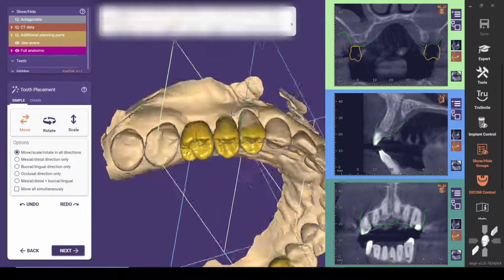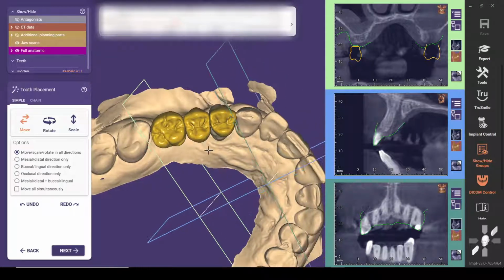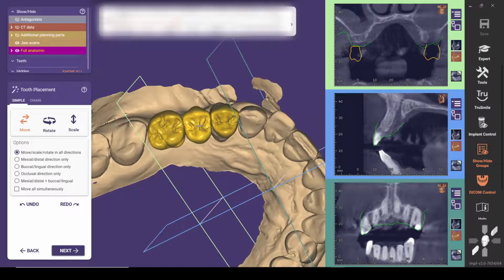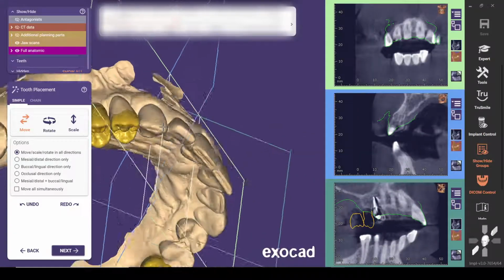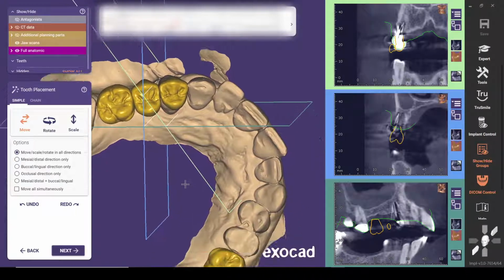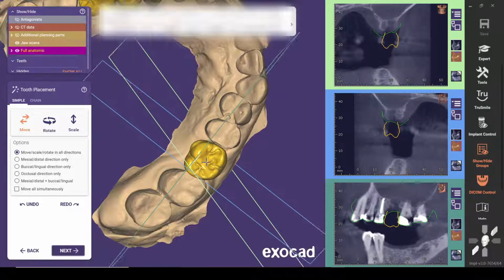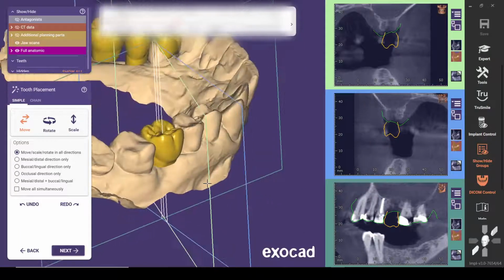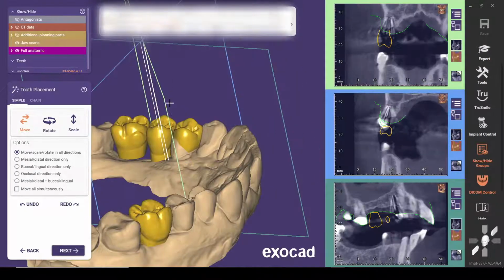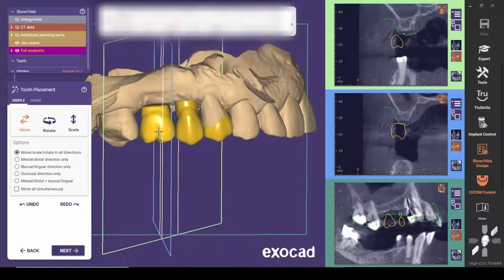Good. The other shortcut, I'll just talk through some shortcut buttons as I go, even though it's repetitive. But the center wheel button, the wheel does your zoom in and out, but if you click on that down, that will reset your view and also reset your axis of spinning. And I use this a lot instead of having to hold both mouse buttons and move the model to my focus point and then clicking the center button to reset my axis of rotation. A lot of times, let's say I want to get to this tooth over here, I'll just click on the center button and reset my view. It's a little bit faster to move around an arch. So you'll see me doing that a lot.